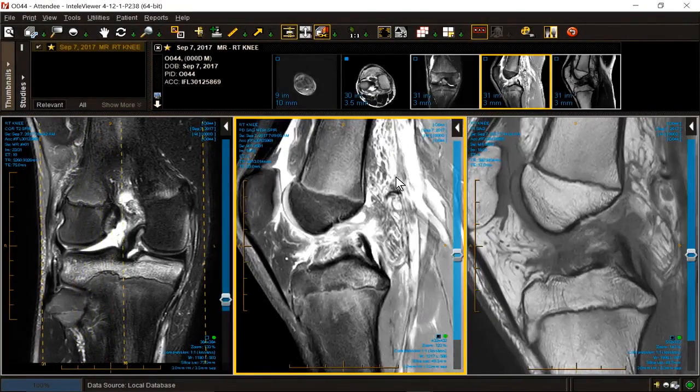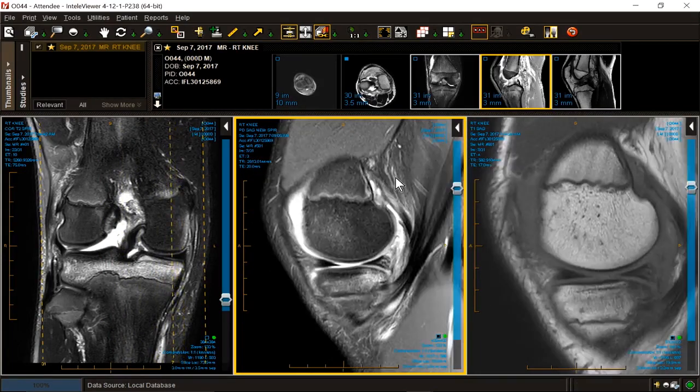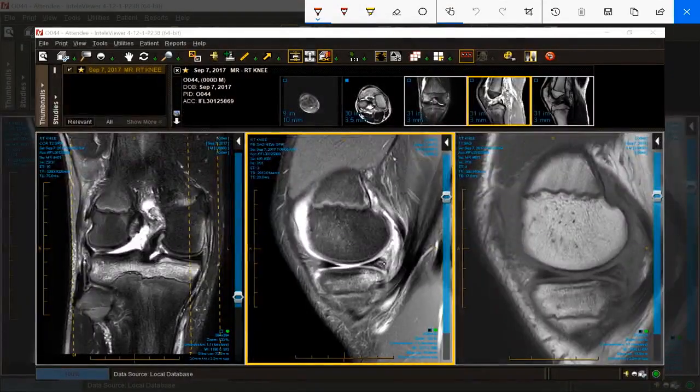Now, I alluded to the fact that the medial side was easier. It's not. We talked a little bit about the break-stop mechanism of the posterior medial corner, which basically prevents the meniscus from flopping back, especially in knee flexion. If the meniscus flops back in knee flexion, it gets pinched, and eventually it will rupture or tear or displace. And you'll get the meniscus doing this, flopping forward. And this patient has a problem.